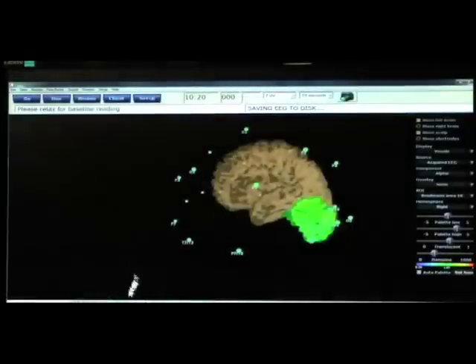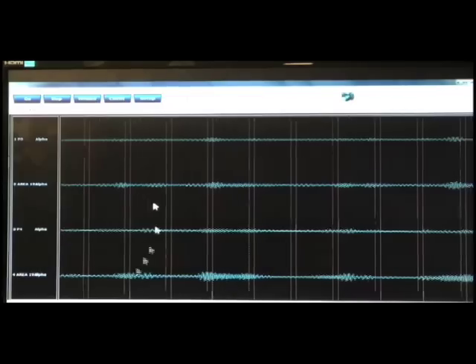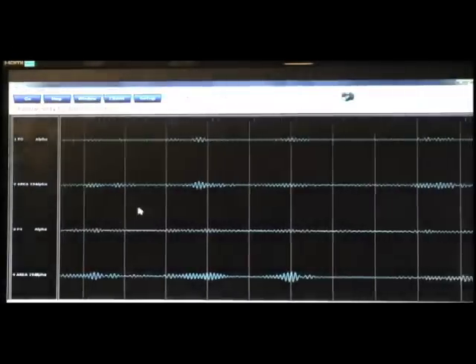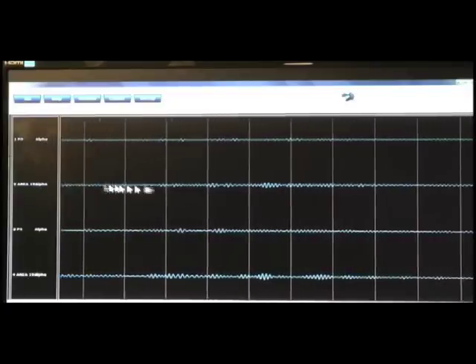So to illustrate how this looks then, we'll go to this display here. Remember, tab 1 is our raw waveforms. We've set up tab 2 to be the training channels. So here we have the training channels, and we're showing the alpha. And what we have then is P3 on top, and then area 19 on the left is actually channel 2.